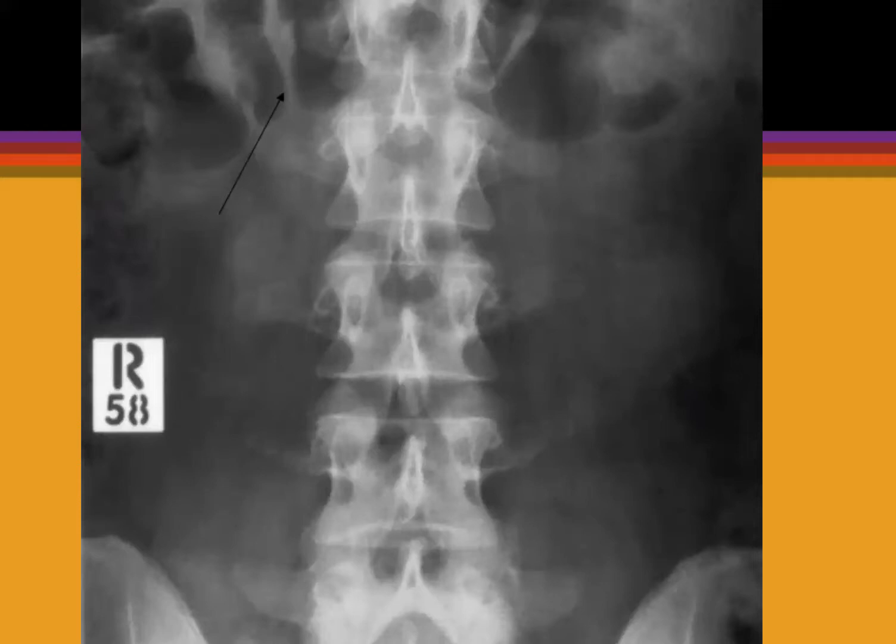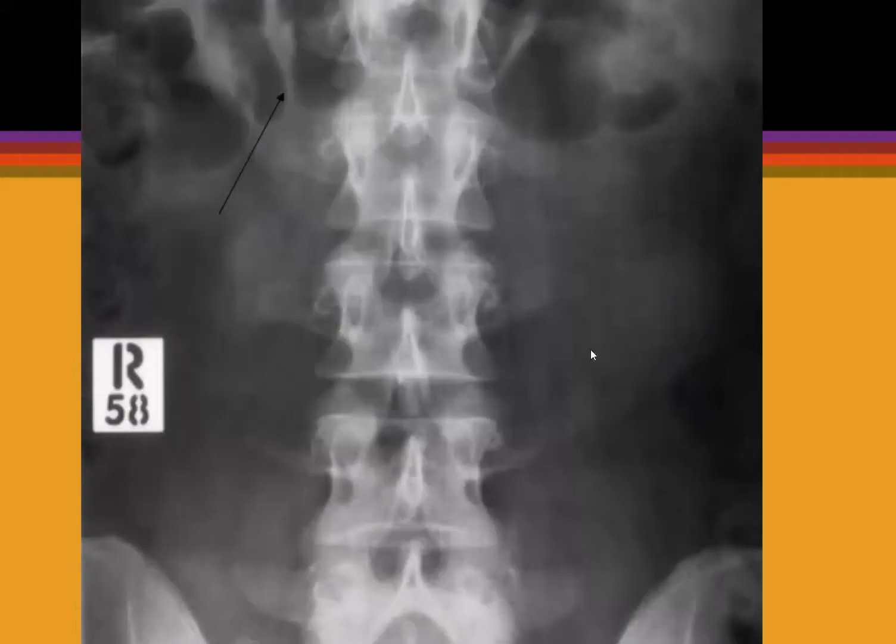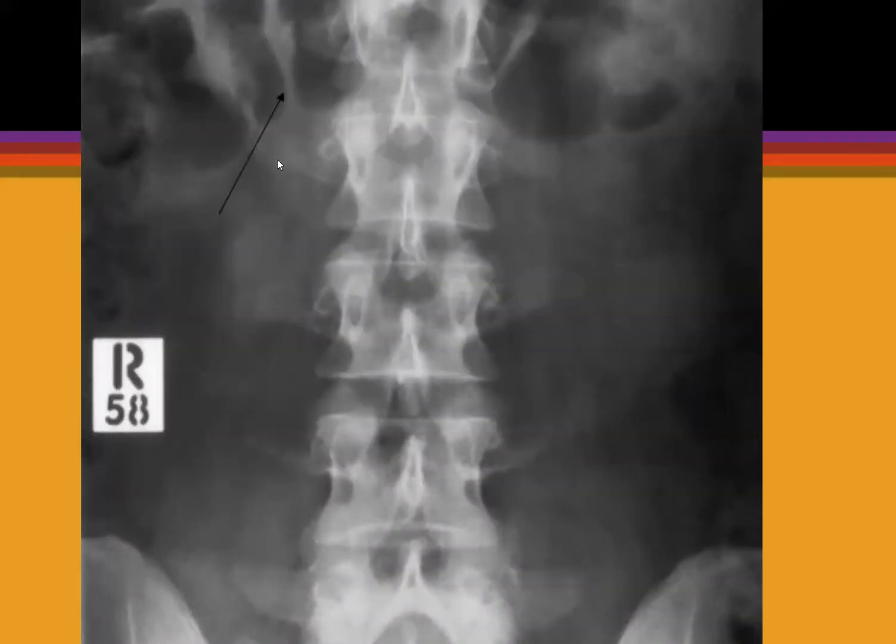And compare this bowel fold to these small bowel folds, which are actually complete, and they're much smaller and more centrally placed. So these are valvulae conniventes within the small bowel. So large bowel, small bowel. You can tell the difference because of their anatomical location. This is at the periphery, as you know, the large bowel is on the periphery of the abdomen, and this is more central with these complete valvulae conniventes.